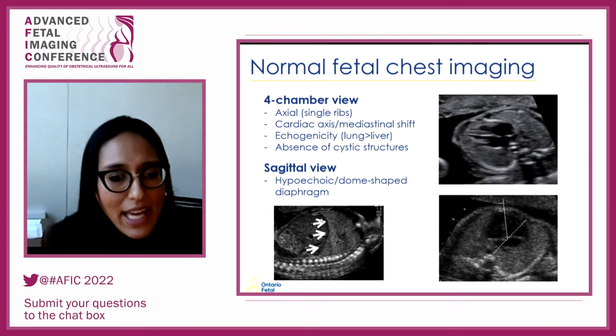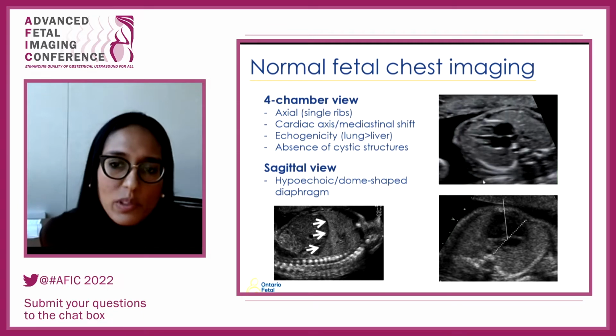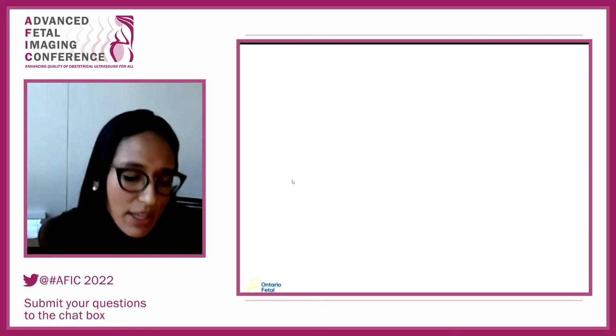The presence of that helps you look at the integrity of the diaphragm. But really, even for the diaphragm, to suspect an abnormality, we will look at the 4-chamber view. So those are the key views, and the 4-chamber is, like I said, the main view of interest.